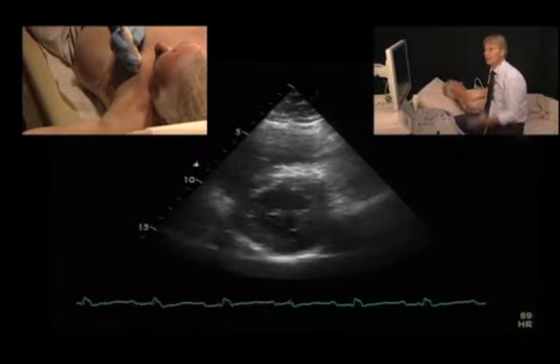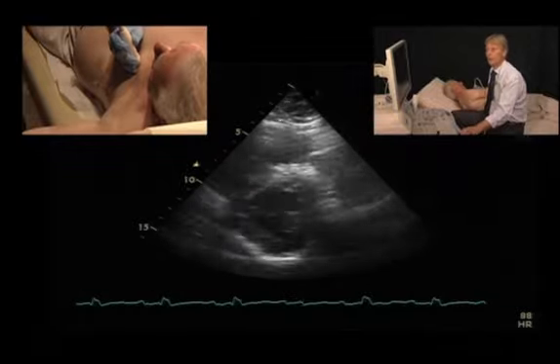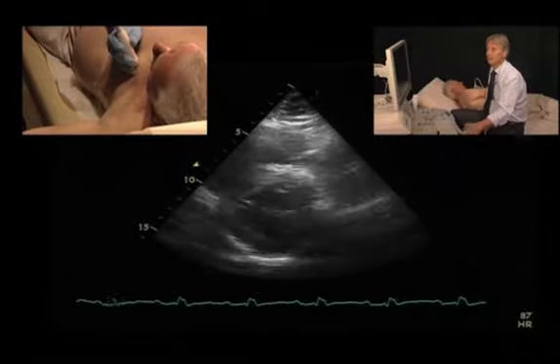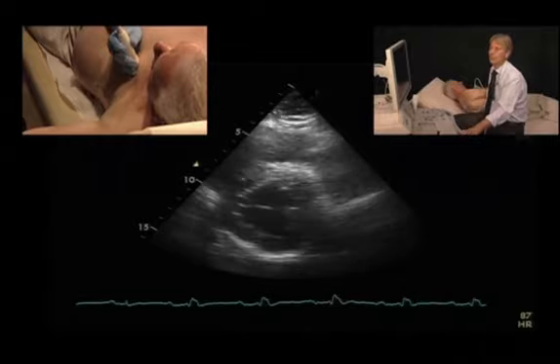Certainly hypertrophy can also be asymmetric in patients with hypertensive heart disease, but this altogether looks very much like hypertensive heart disease. If you look at the clinic of the patient as well, and you know that the patient had hypertension for many, many years, the diagnosis is quite clear. Okay, so are you ready for the next case?